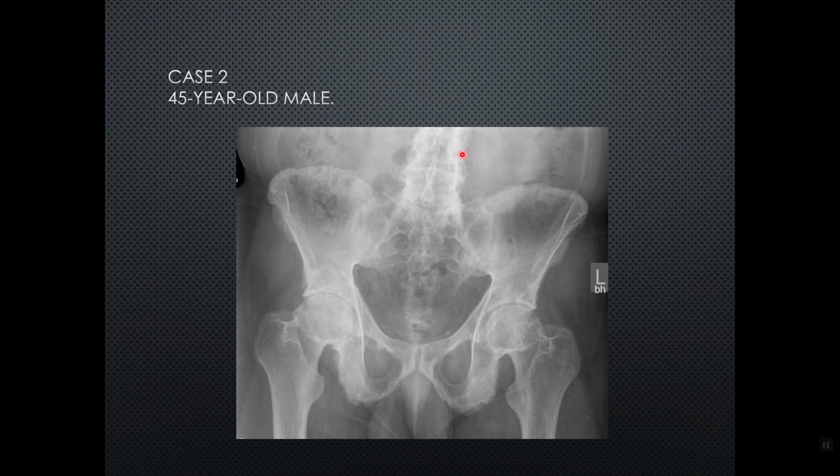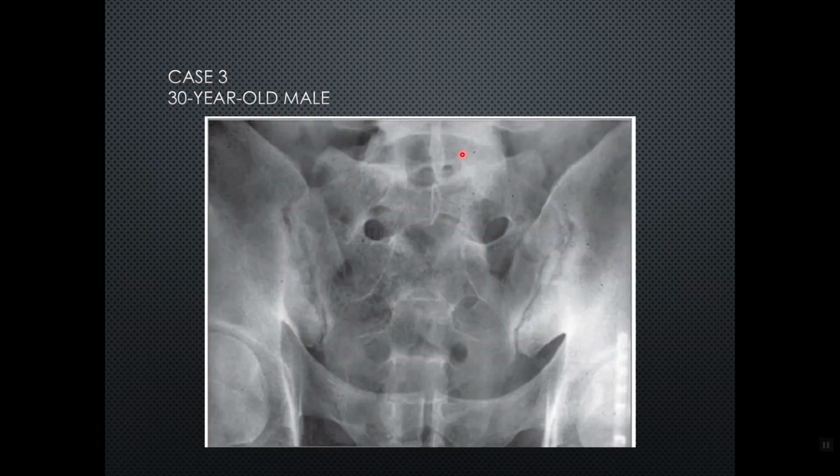So again, a diagnosis of AS is highly likely in this case, or enteropathic arthritis, because they present radiographically very similar, sometimes indistinguishable. The learning outcome in this case is for us to appreciate sacroiliitis. For instance, you can see a 30-year-old male with back pain. If you obtain a radiograph and you find these radiographic findings, a diagnosis of any spondyloarthropathy, not just ankylosing spondylitis but any of them, should be high on the list.